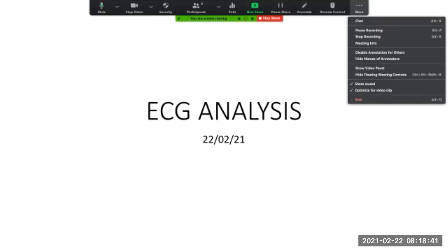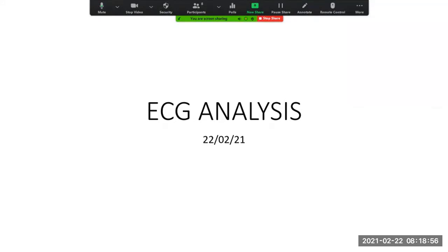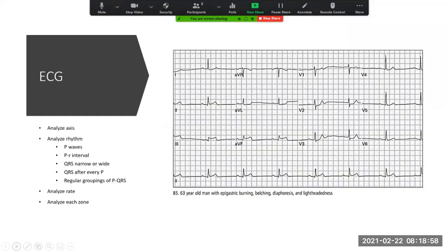All right, good. So let's start. So we're going to start with an ECG for today. Okay. So Sharon, don't stress. I'm not going to stress you all out too much. I'm going to be expecting the people who are on Zoom to actually answer a little bit more. Right? So let's start with today's. Let's move to the first. Right. So that's our ECG.